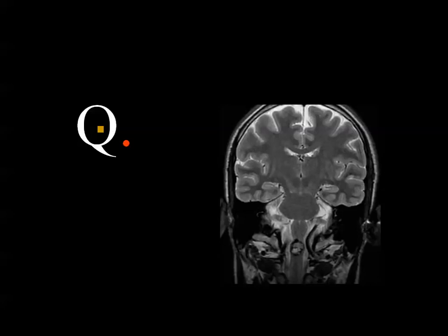Coronal T2 of the brain. Mesial temporal sclerosis. Right side. On the right side.